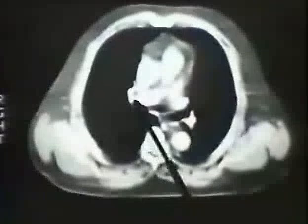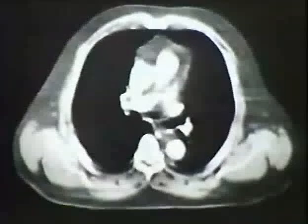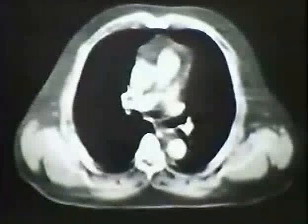If you look at this on the lateral view, here in the arterial phase, you see the artery, but you see that the vein coming down from the upper lobe takes a detour around the prominent arterial shadow and therefore becomes quite conspicuous on the lateral chest film. This, however, does not become so conspicuous on the CT scan, and you have to work quite hard, I think, to pick up this little shadow over here, lateral to the somewhat compressed superior vena cava, represents at least a portion of the right upper pulmonary vein in this patient.